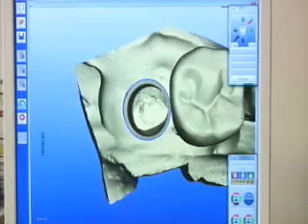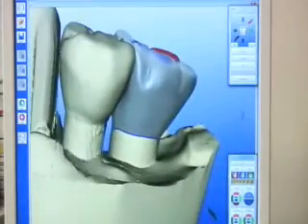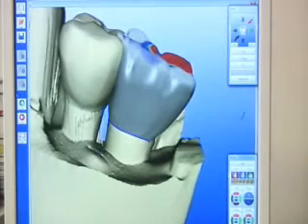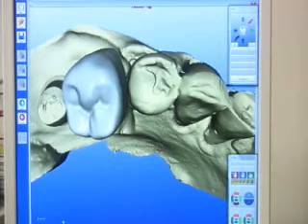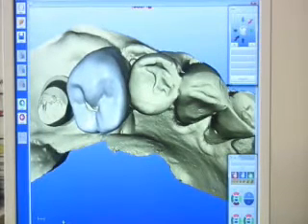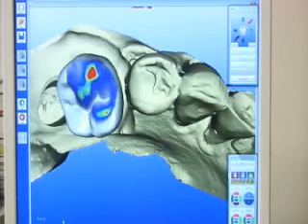In this case, since it's just a green arrow case, we did the premolar, we rendered the molar. You can see how the contacts are all skewed, and the mesial distal width of the molar is not much greater than the mesial distal width of the premolar. I'm going to redo the case in which we're going to use the assistance of the posterior overlay.